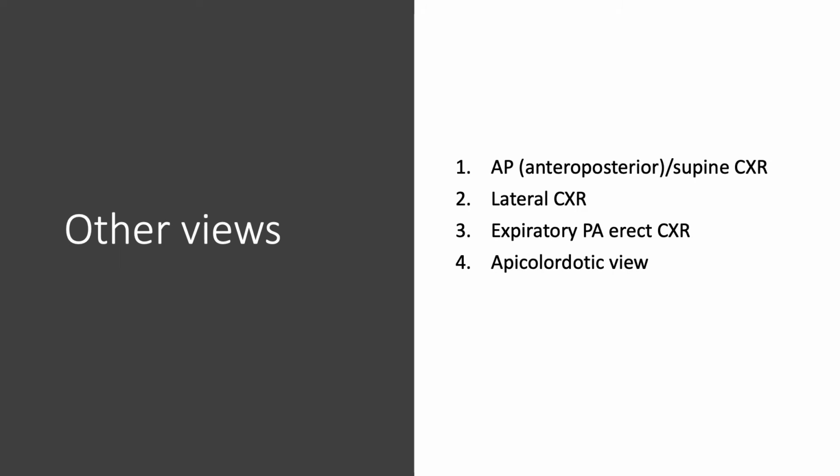There are of course other views in which X-rays can be done, such as anterior-posterior or supine chest X-rays, lateral chest X-rays, expiratory PA erect chest X-rays, and apicolordotic view.